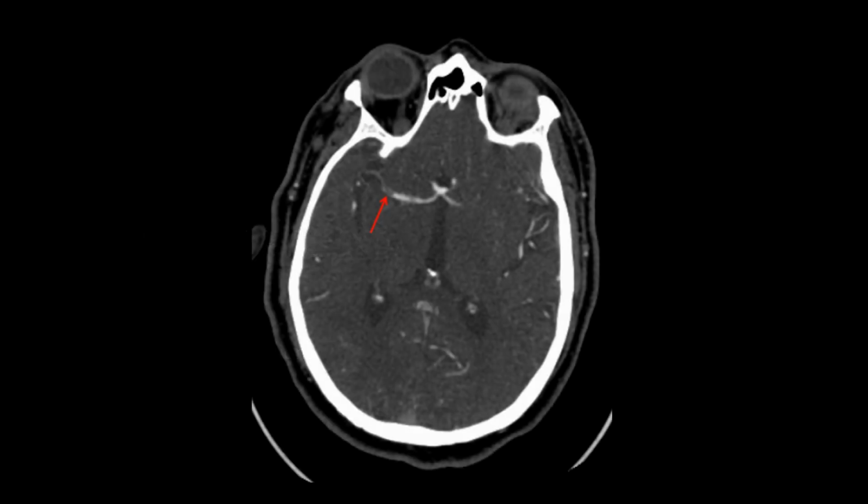Once an infarct is identified, CT angiography is done to identify the arterial occlusion responsible for the infarct. Iodinated contrast is injected intravenously, usually in the arm, and the study then timed so that the head and neck are imaged when the contrast is passing through the arteries of interest.